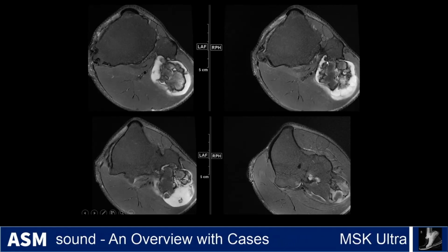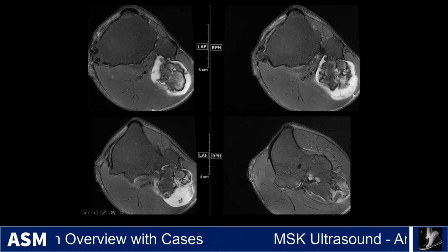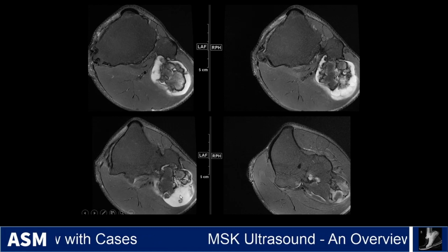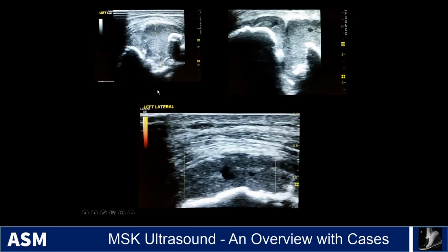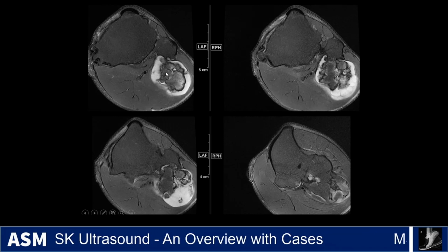And on the MRI, you see this exostosis coming off the fibula here with this thickened PDFS hyperintense tissue right here. So this is pretty thick. And the question was, is this cartilage or fluid? And this is probably going to be cartilage. And you see all these other ones without really thick caps. There's a tiny cap on this one here.